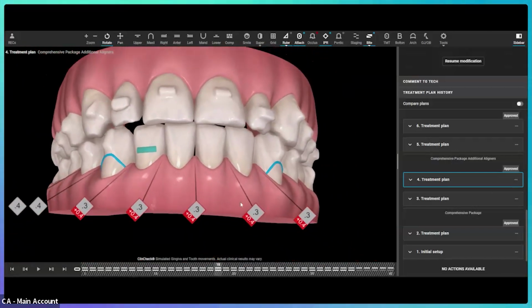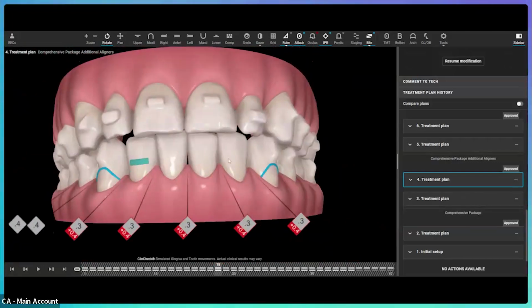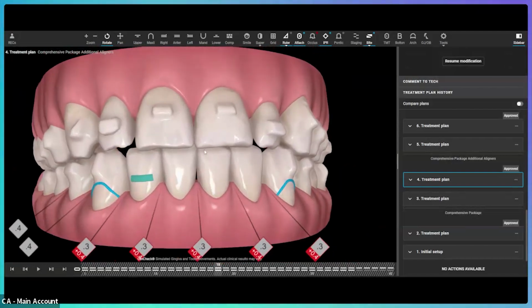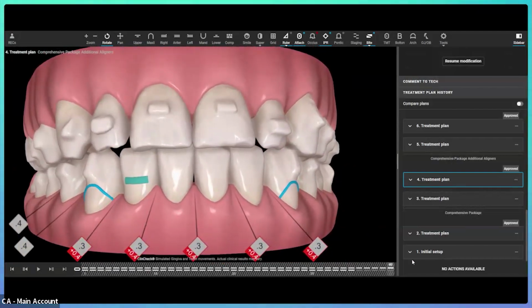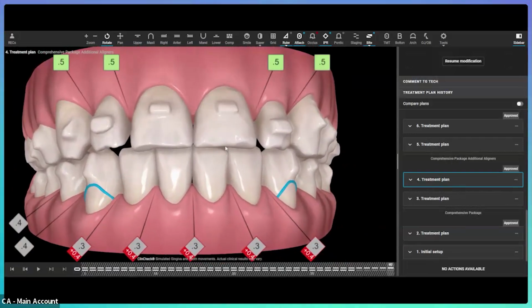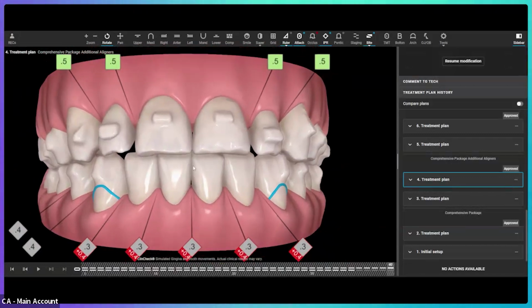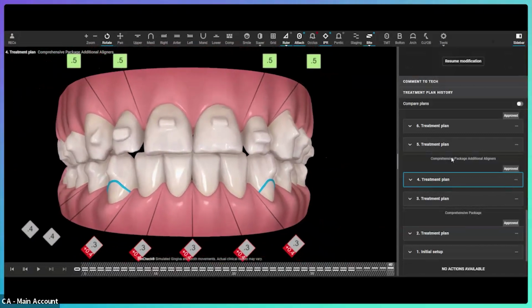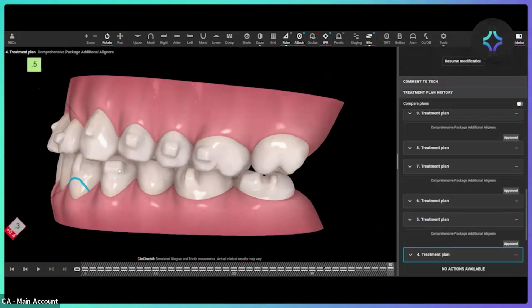So we added 0.3 millimeters in on the lowers and 0.4 because we're trying to move his midline on the lower slightly over. And again, I'm okay doing IPR if need be of more than, or usually up to 0.8. But again, Dr. Tarek Albiali, who's an amazing orthodontist, he'll do IPR of up to 1.5 if he really, really had to in a significant class 3 case.